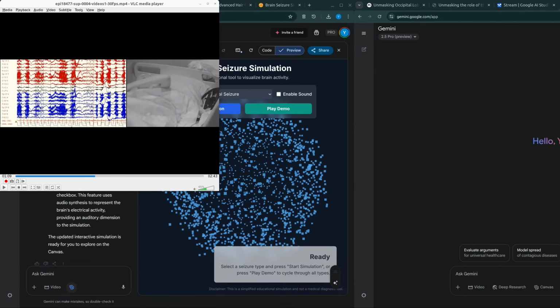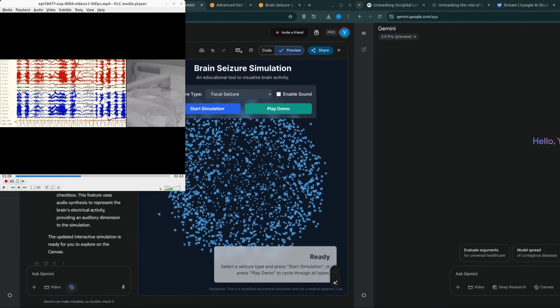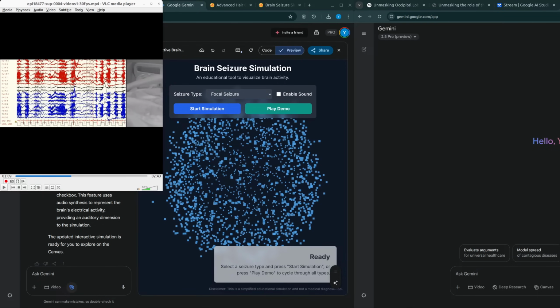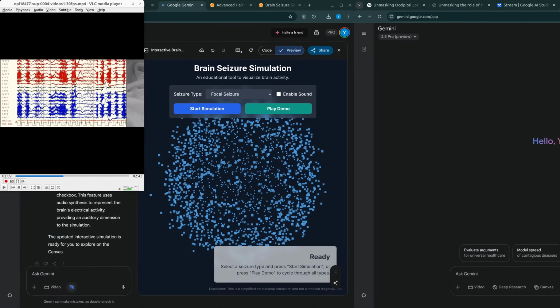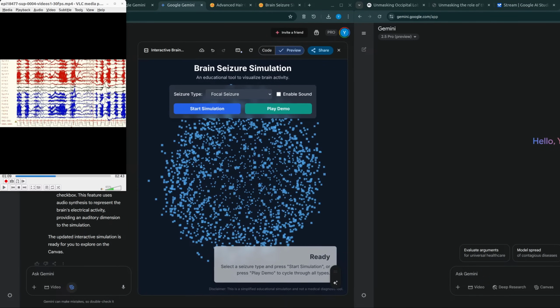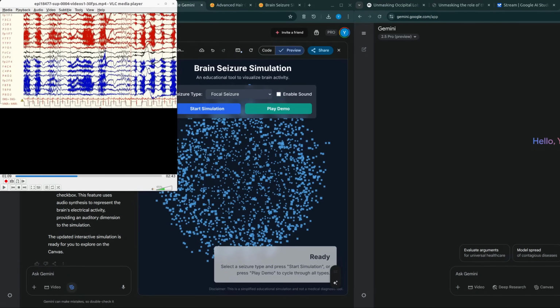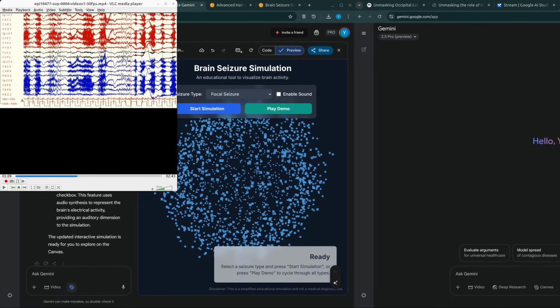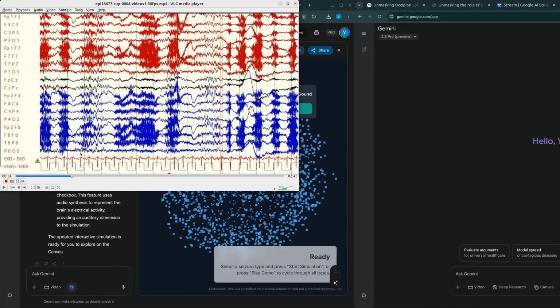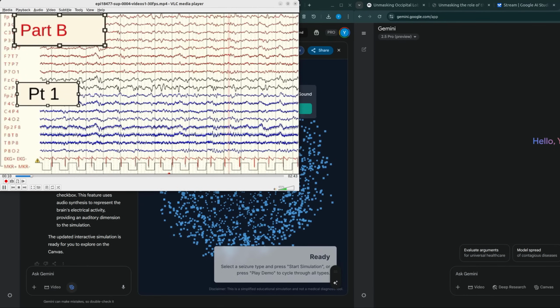If we hide the patient again. Let's extract two images real quick. Let's extract, yeah, this one, which is meant to be baseline.